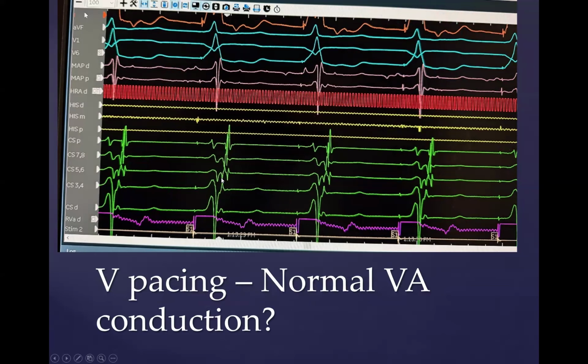And the pair, if we go to 5-6, I think we would agree that this pair is clearly later than either 3-4 or distal. So we know, therefore, that the pathway is somewhere between CS distal and CS 3-4. And that's exactly where the pathway was mapped to.